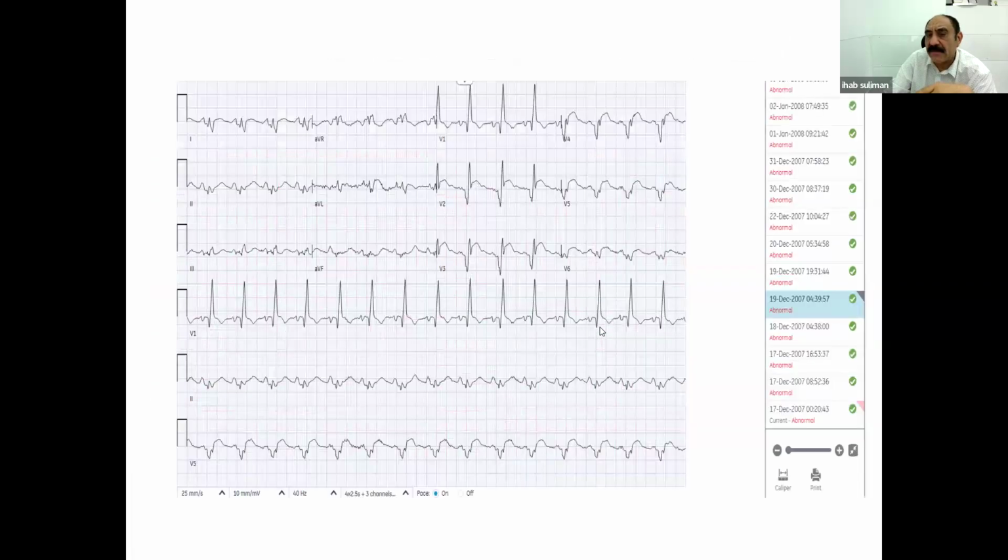So this is what happened for this particular patient, but unfortunately, he ended up with a very poor LV function. This is another ECG of the same gentleman. There is RBBB with ST elevation from V1 until V6 and also involving lead 1 and aVL. The patient here is less tachycardic than in the prior ECG.